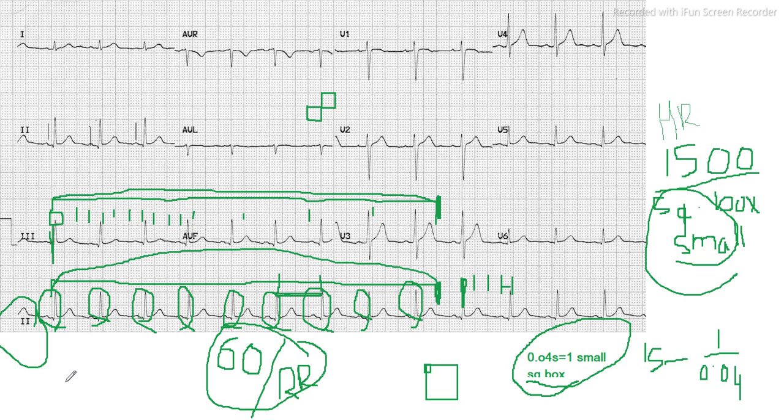So the formula you can use is the number of QRS complexes per 6 seconds, and you multiply it by 10. Because in 6 seconds you have 9 QRS complexes, in 1 minute, that means 60 seconds, you will be having 90 beats per minute. So this way also you can find the heart rate.